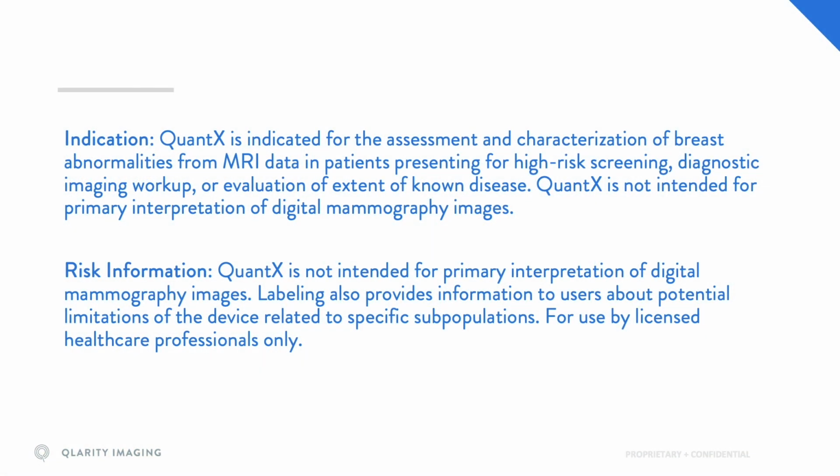Indication: QuantX is indicated for the assessment and characterization of breast abnormalities from MRI data in patients presenting for high-risk screening, diagnostic imaging workup, or evaluation of extent of known disease. QuantX is not intended for primary interpretation of digital mammography images. Labeling also provides information to users about potential limitations of the device related to specific subpopulations, for use by licensed healthcare professionals only.